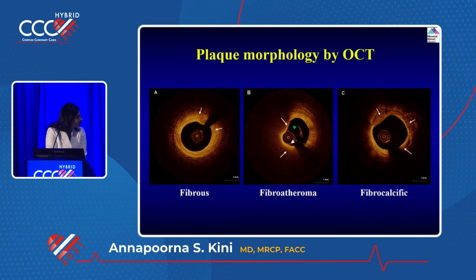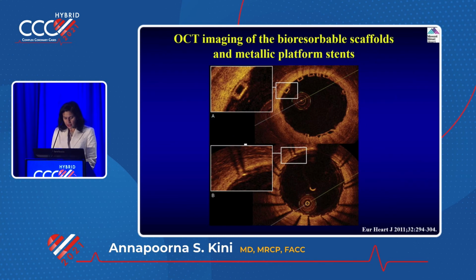Nice bright fibroatheroma. This is lipid. This is how you learn how to calculate the cap. And if you have calcium, you see a nice border here. That's how you differentiate. All the way from here, you see that? Close to 360, 3 quadrants. They may not show this, but you have to know the difference.